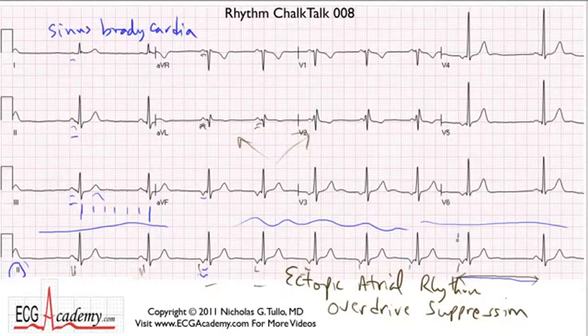But when the ectopic atrial focus stops firing, then it takes a little while for the sinus node to kick in again, because of overdrive suppression of the sinus node. We see this commonly in sick sinus syndrome, where you have a tachyarrhythmia and then post-tachycardia pauses. The common cause of lightheadedness in patients with tachy-brady syndrome.